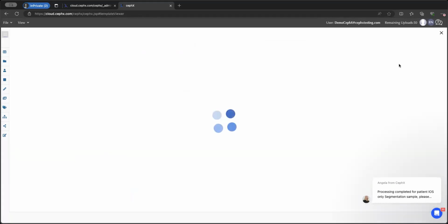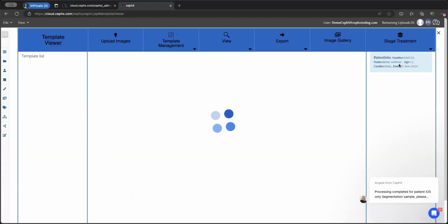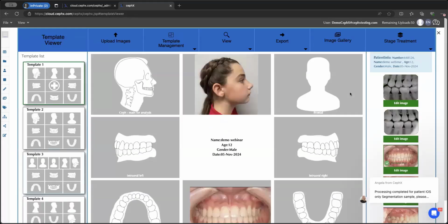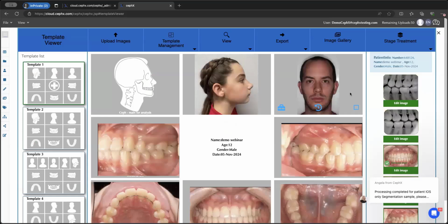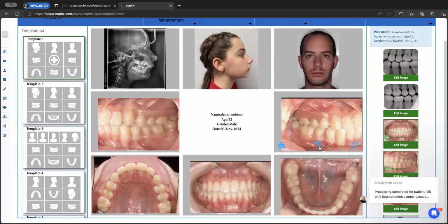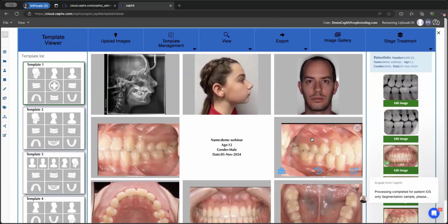We can directly go to the gallery, and what you get is a prepared gallery. We didn't have to do anything for this. We just uploaded the images, and it figured out which image is which and stuck them in the gallery automatically. Usually this is a bit of a headache of a task.